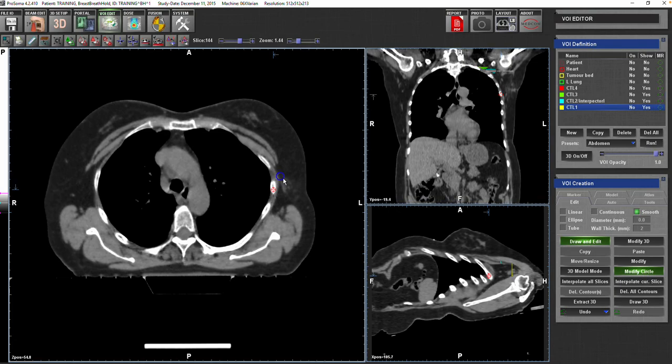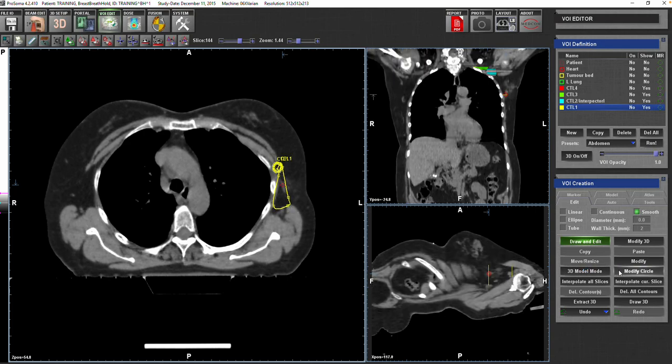And again, you will follow the same principle. What is the same principle? I want to be lateral to the pectoralis minor muscle, and anterior to the thoracodorsal vessels, which I will not take. And then you have nothing else to do except go to the chest wall. Sorry, it is not very nice, so let's do it like that. And then join a line from the pectoralis major to the latissimus dorsi muscle edge, an imaginary line.